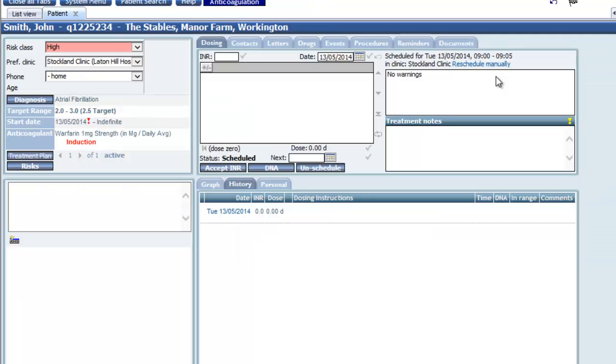Once you've actually added the patient onto induction, the screens and the displays look very much like the maintenance module, in that when we put in an INR result, Dawn will go away, find the appropriate induction algorithm rule, and use that to apply the appropriate dose of warfarin and the next test as well. During induction therapy, most protocols do suggest testing at intervals of less than a week. So Dawn is able to automatically customise the instruction, so it starts on the correct day and it only includes the days until the planned next test, so it will show you it quite clearly there.